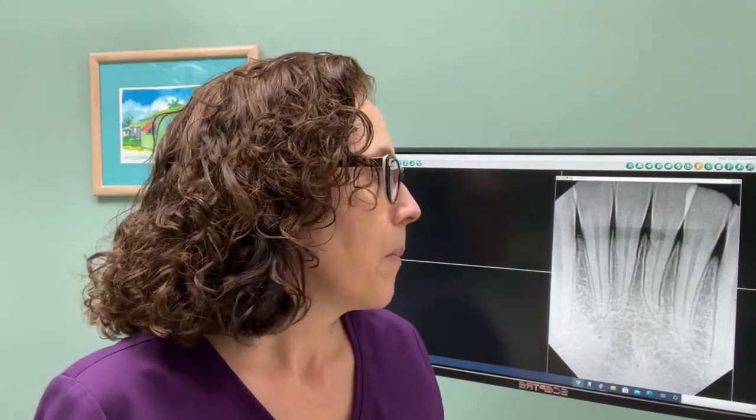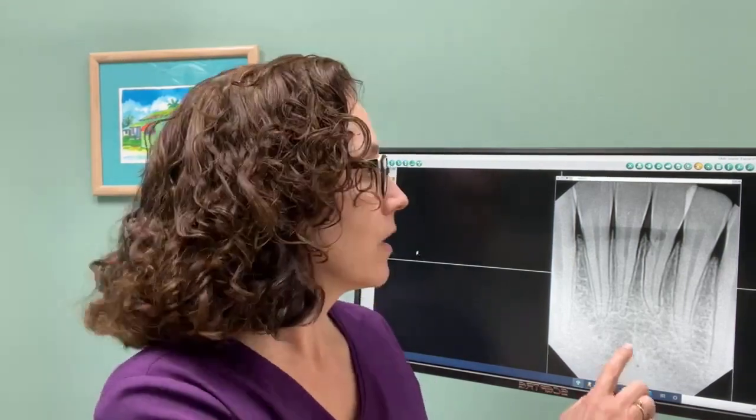There are other things that we can see and reasons why we take the x-rays. But the last one I wanted to go over with you is something called resorption. And resorption is this natural phenomenon. It doesn't happen a lot, but it does happen sometimes. And it's this strange situation where the tooth kind of sort of starts to eat itself. And so it's not a decay, but it is a loss of tooth structure. And a lot of times that's down on the root surface. So it's like at the area of the bone. And so you can't see that. Sometimes it's from the inside out, sometimes it's from the outside in. But when you have an x-ray, you can see.